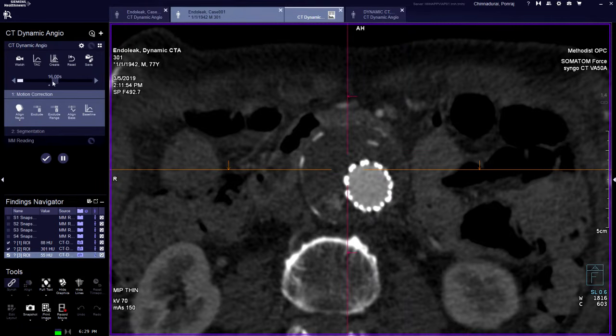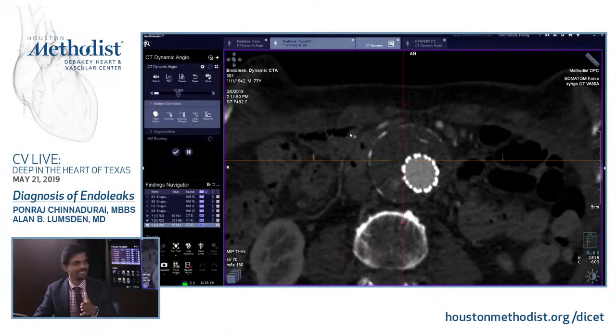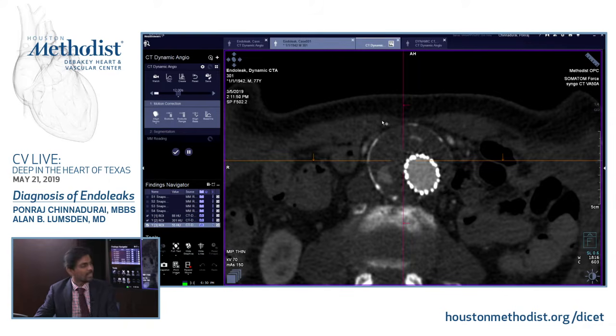So now I go to an arbitrary mid time point where I know for sure I can see it. So it's kind of like going through the midline of the time attenuation curve. Let me ask one. How do you know how long to image? So this is something that has been studied. This is not novel. People have done dynamic CT imaging. So here we are talking about how this all ties to the final procedure. But at least this dynamic imaging has been available for cardiac perfusion imaging as well, or peripheral perfusion imaging.